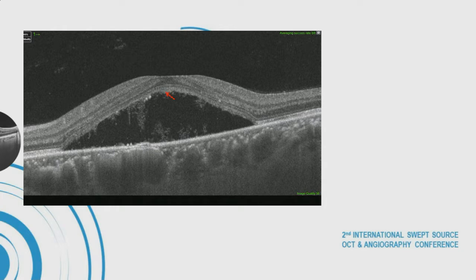Let us point to some crucial features like the stalactites hanging from above, the stalagmites at the bottom. Those are believed to be remnants of photoreceptors that fail to be phagocytosed by the RPE because of the loss of contact. Then we have granular aggregations of such material. We have some atrophy of the outer photoreceptor structures.